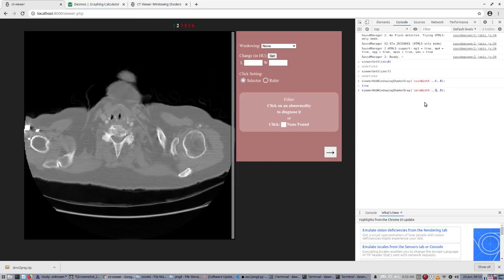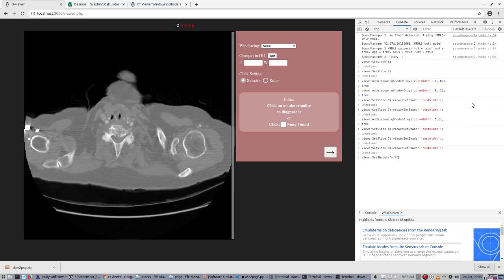And I'm also going to create a zeroed window for my zeroed image. And as we cycle between the two, you'll notice they look the same. And if I turn off the window, you'll see that the image we just made is a little darker because our wider range pushed the normal values in the human body down a little bit.